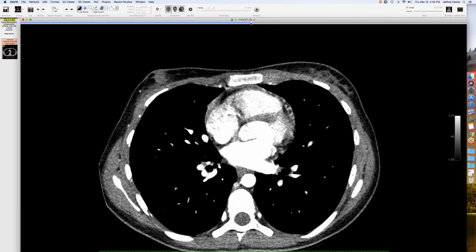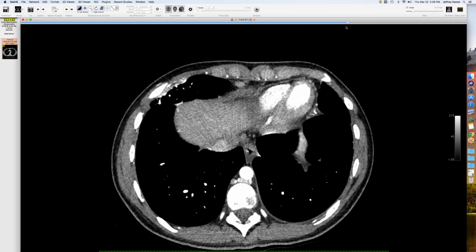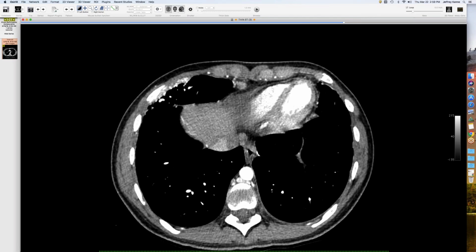So do you think this is just some congenital malformation? It looks more like acquired vascularity to me than some sort of congenital thing. I mean, it's going subphrenic here, just all on that pleural interface.